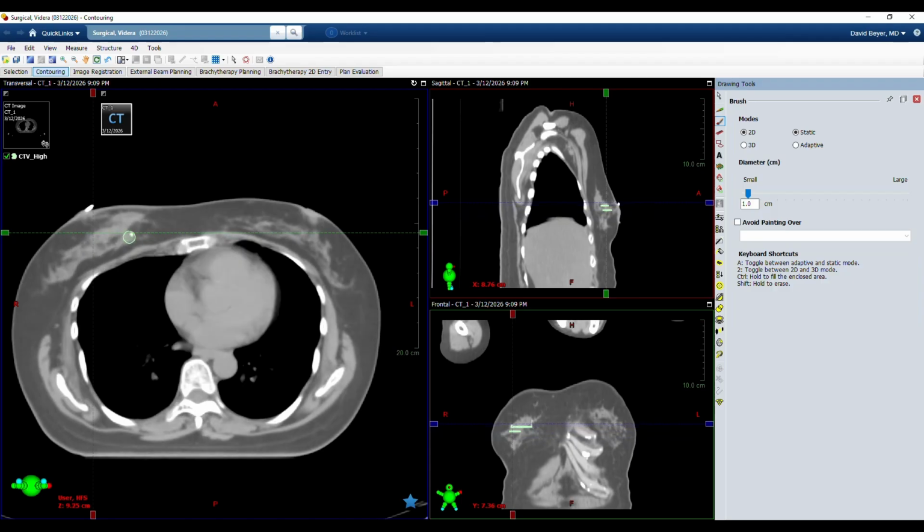So moving back down, so there's the clip. I think this is part of the tumor bed. I'm pretty sure this is, although I'm really not sure. Where do I draw the line here is really hard to tell. It's kind of a guesstimate, and I don't like doing guesstimates. As I move further, again, where's the line? Is this it? Is it a little more to the left, a little more to the right? How about this tissue? Is that part of it? Is that not part of it? I think it is.